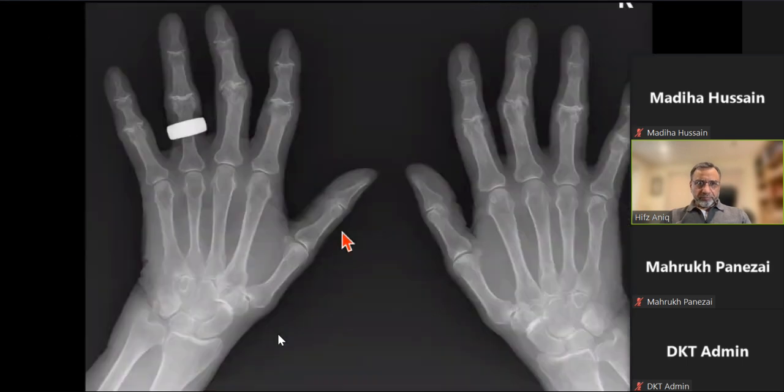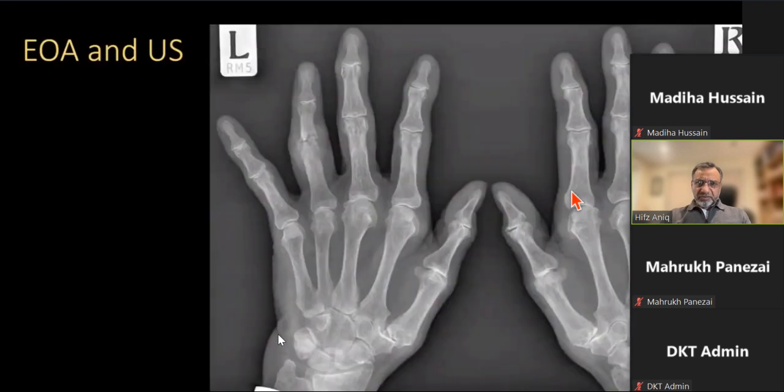Let me show you another example. You can see that multiple joints are involved with loss of definition and collapse there. You can see that there's a bit more collapse now. Look at the alignment now. It's gone on the under side. So it is a clear deformity on the right side. Okay. So this alignment is side on, with extension. Okay. So just go back.